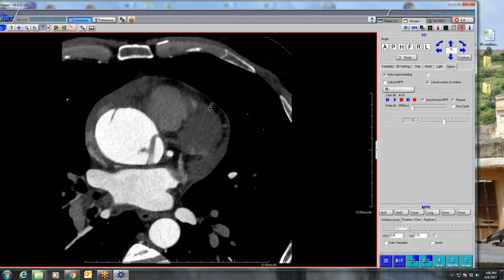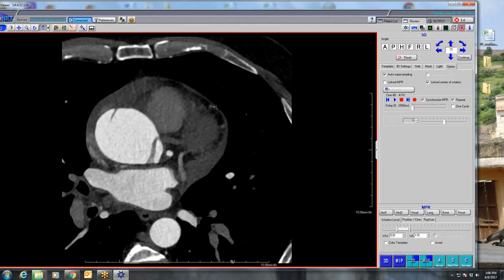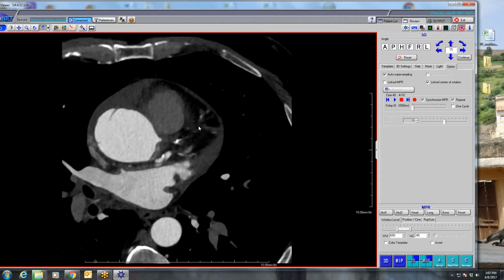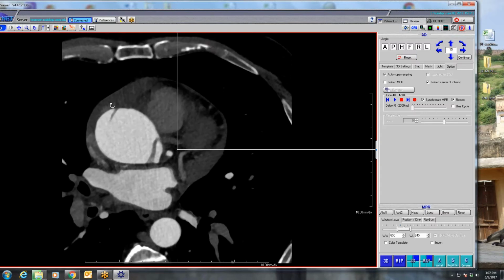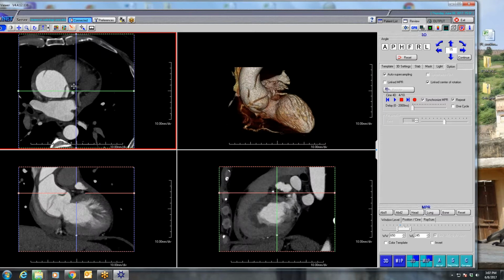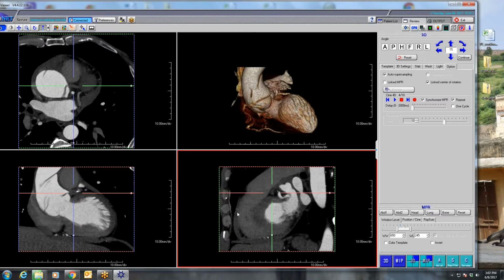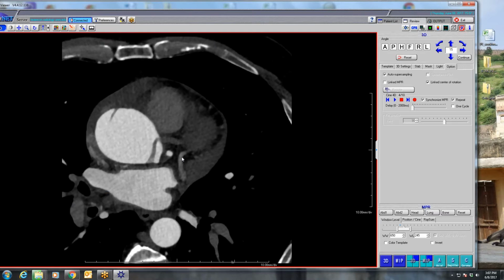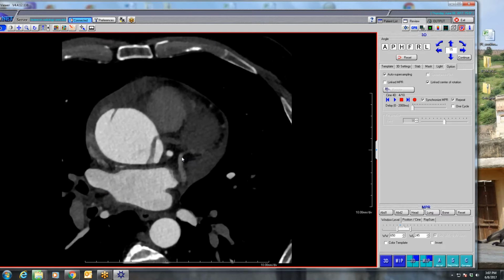So one thing you'll notice is that he's got this type A dissection, and his LAD was what looks like his left main, but actually just turns out to be his LAD is completely knocked out from basically the dissection flap extending into the ostium of what should be the left main, but is in fact only LAD.